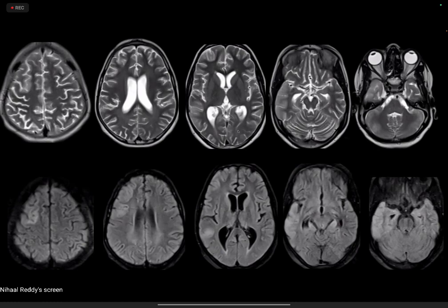Yes. So on the MRI, we can appreciate again global reduction in volume, predominantly in the cortical regions, supratentorial and infratentorial. There were some subcortical patchy hyperintense changes. See over here in the right frontal lobe and the temporal lobe, especially on the T2 sequences, better appreciated on the FLAIR sequences at the bottom. The subcortical patchy hyperintense changes are in the frontal lobe and bilateral temporal lobe, see in the last image over here, right temporal lobe slightly more than the left. Basal ganglia, possibly the putamen, slightly reduced in volume.